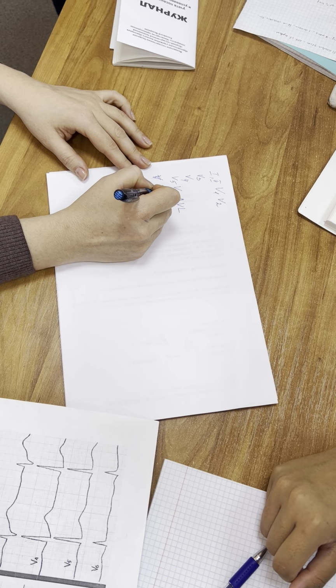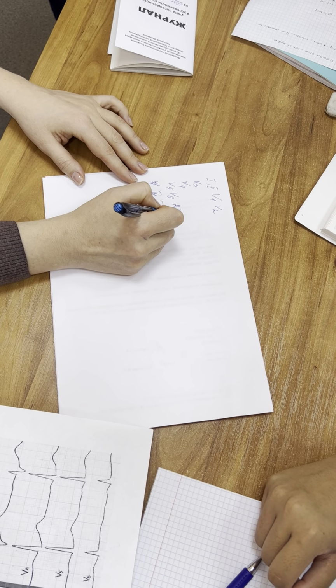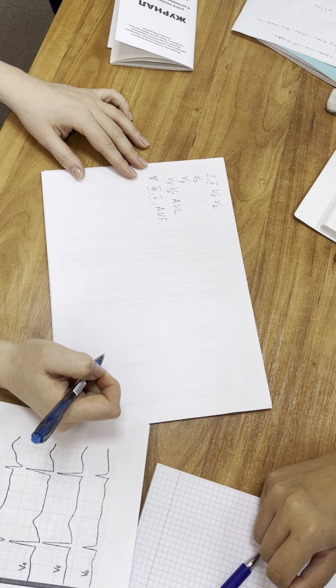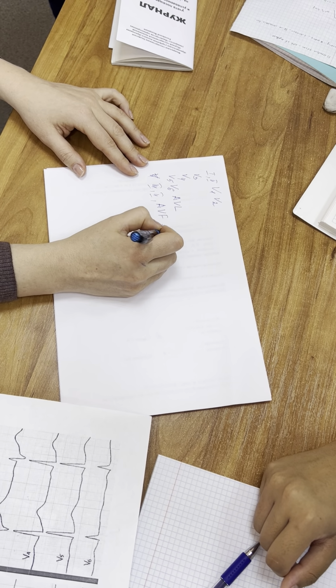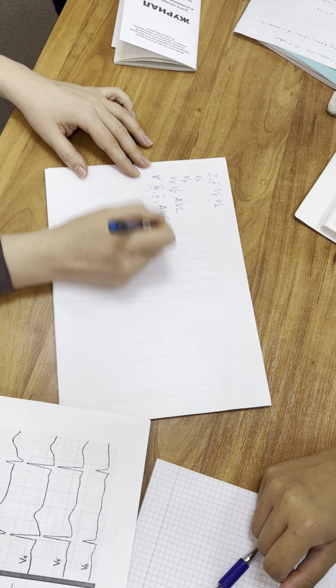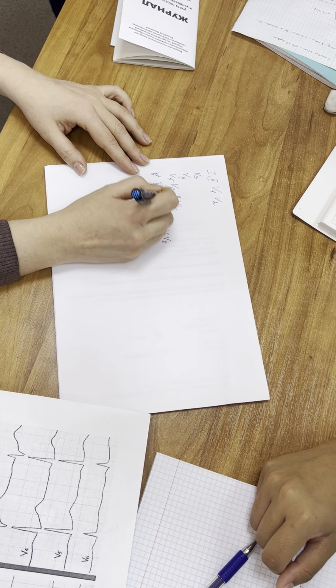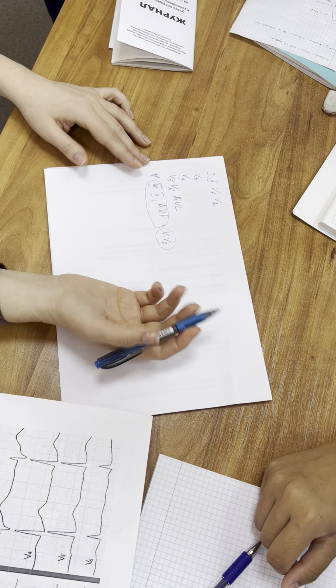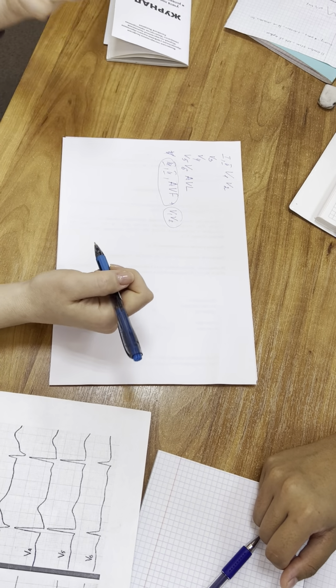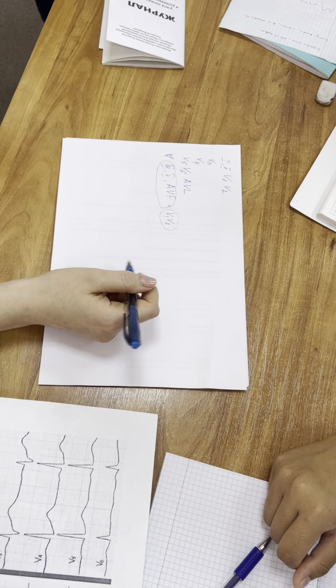Third standard lead plus second plus AVF: inferior. Plus V1, V2: posterior. This is difficult. Classic. This location, posterior location, is more difficult to understand. How can we understand it?